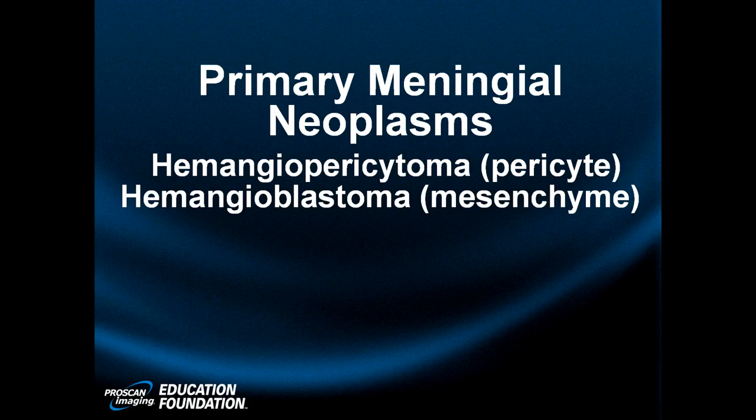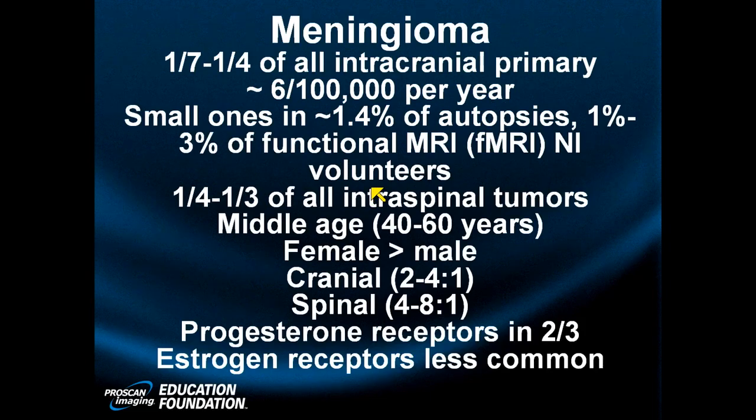And yes, hemangioblastomas, not associated with von Hippel-Lindau, may also involve the same location, but much less commonly. So these two can simulate one another, but this is about 10 times more common than that. I have never seen a meningeal hemangioblastoma.